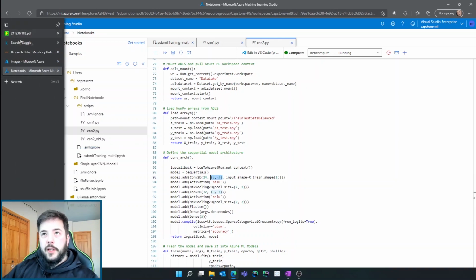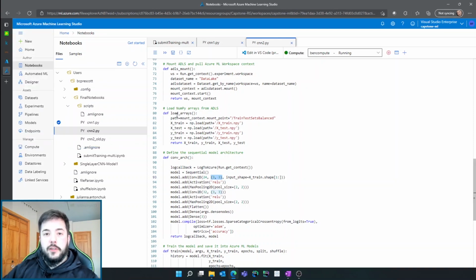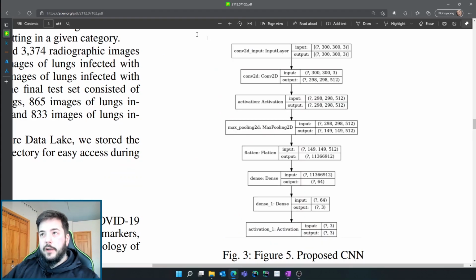What it does is essentially a multiplication and summation from your input matrix, which is 300 by 300, against the 3 by 3. It's actually going to reduce your feature map, which is an output of those that represents the original image. So the feature map itself will actually be a different size. That's why you see these 300 by 300 images reduce in size over time to like 149 by 149, but you can also see the number of channels or feature maps it's creating go up, right? So you will see something like this in your summary if you printed it.